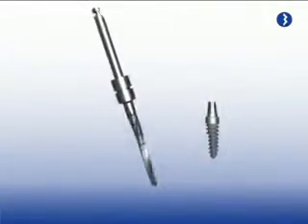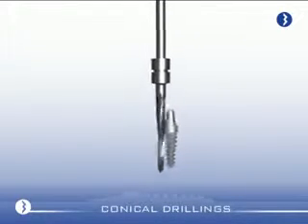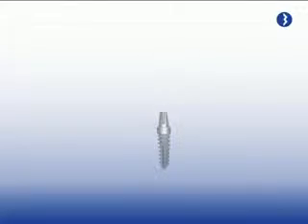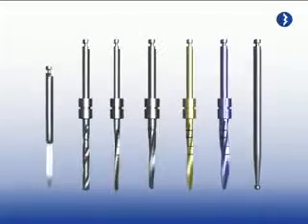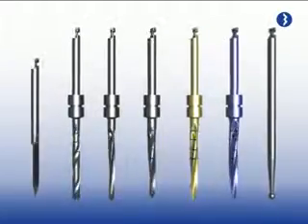The drills of the Treenon system are conical and their diameter coincides with the base of the implant. The Treenon Q implant system, faithful to its initial simplicity, has a reduced number of drills that we can visualize here.